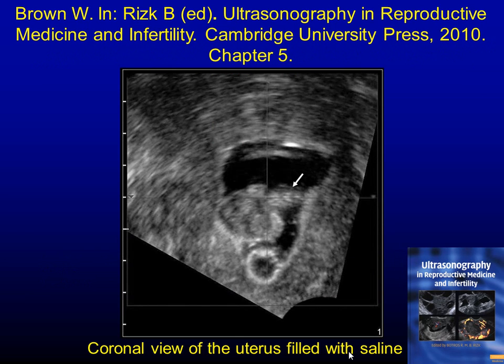So there is a coronal view, and with the coronal view, you're cutting like that. There is a horizontal view, and you're cutting like that. And then there is a sagittal view, you're cutting like that. When you put the 3 views together, you can determine whether the pathology you have is at the front, anterior, at the back, posterior, right or left. And this is very helpful if you're going to operate on that. If you're just going to report that these are fibroid uterus, then it doesn't matter. And this is a big difference as well between radiology and gynecology.